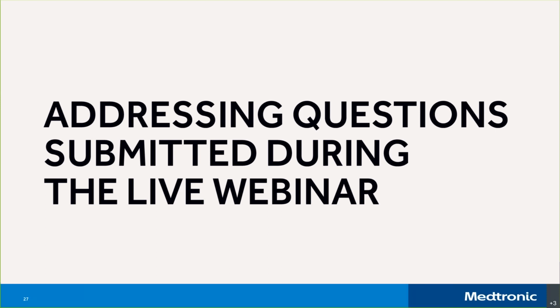Awesome. The next one says, there's so many reports available. Which one do you recommend as most valuable? So we kind of talked about a few of those. With 670G, a lot of people like to look at the assessment and progress report because it puts all of the information on one page. You can see your time in range, your current sensor glucose trends, and some of that insulin usage data.